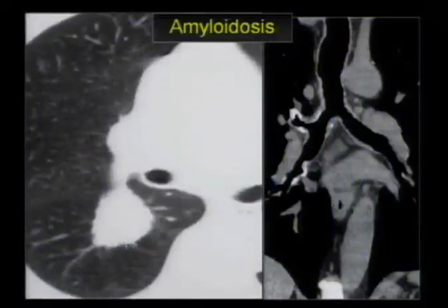Here's the amyloidoma right here. This actually had a little bit of calcium on soft tissue windows, suggesting that it's benign, but there was a significant non-calcified component, so we didn't know for sure. Had to biopsy it, didn't get a specific biopsy answer, so it got resected. That's how it was proven to be amyloid.